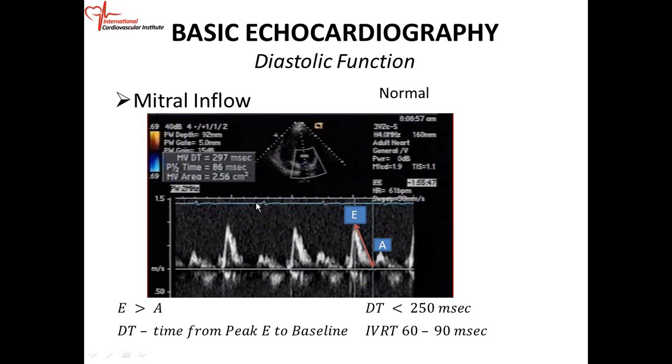If you can see the outline of the left ventricular outflow tract envelope, it's right here, and it ends, it's not clear, but it ends right there. And then we have our E velocity here, and so it starts here. So the mitral valve opens. So the IVRT would be this period from when the aortic valve closes to when the mitral valve opens at the E velocity.